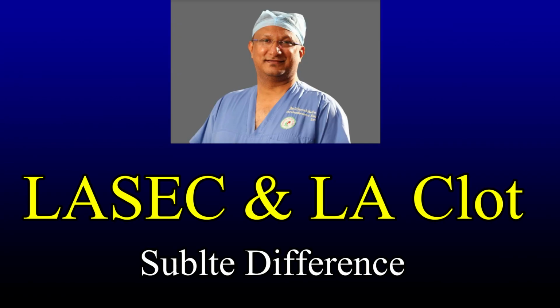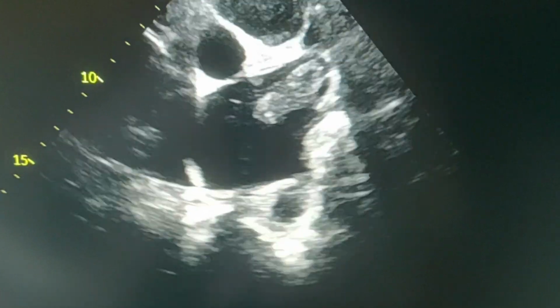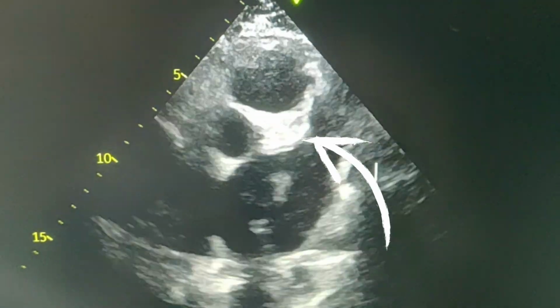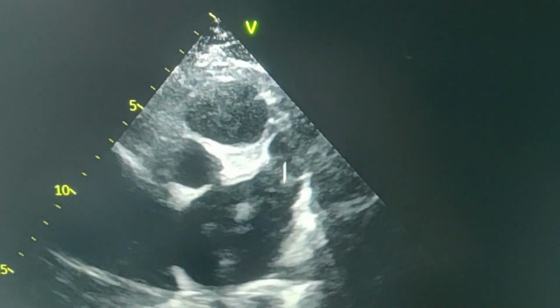So this is a video about LASEC and LA clot, the subtle difference between the two. And this image I have already published. So what you are seeing here is a kind of a layered clot, probably with a cavity in the middle of the clot occupying the left atrial appendage.